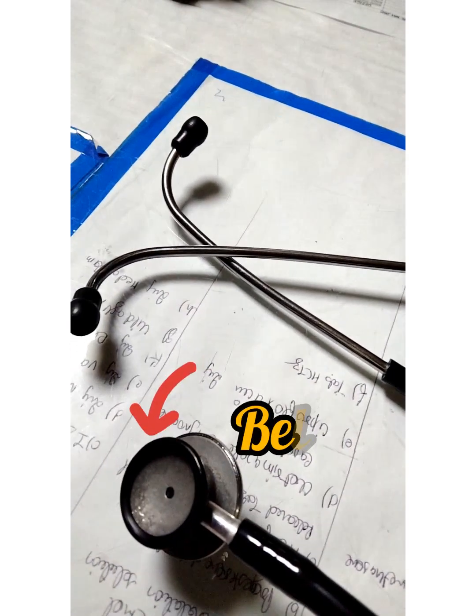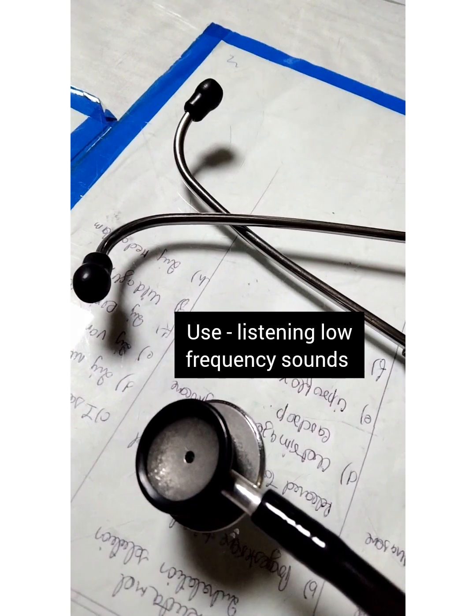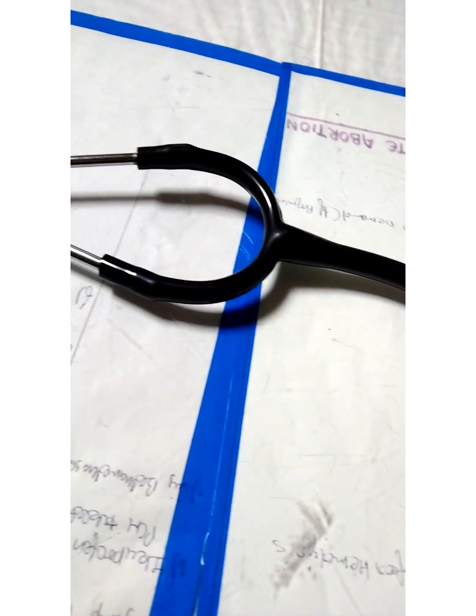Chest piece having smaller diameter is known as bell or drum. It is used for listening low frequency sounds like bowel sounds. It is connected with a long tubular structure known as tubings. These tubings are latex free.